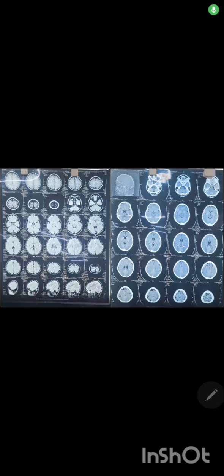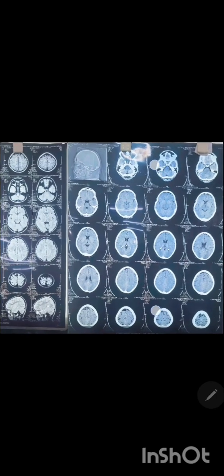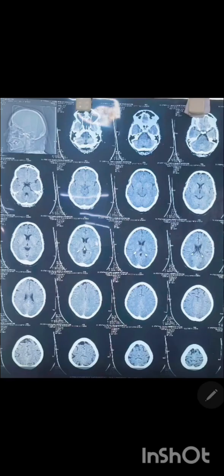What happens when high density tissue is present and when low density tissue is present? When high density tissue is present, like bone, it is a high density structure and absorbs the radiation to a greater degree, so a reduced amount is detected by the scanner on the opposite side of the body.